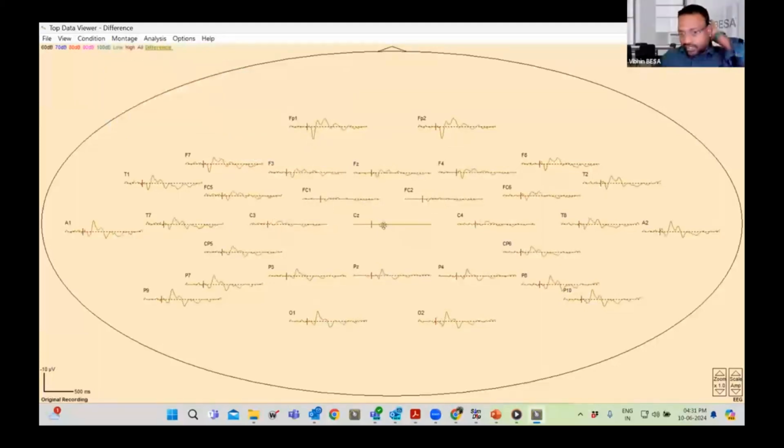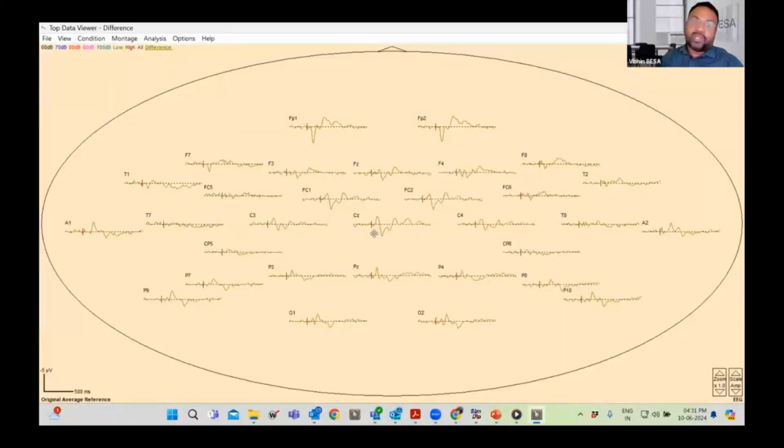If you see this original recording, it is flat. As we know, it is all referenced to CZ. However, when we change the montage to original average reference, we get the activity there, which means that CZ was active and it could have been missed if we did not use different montages.